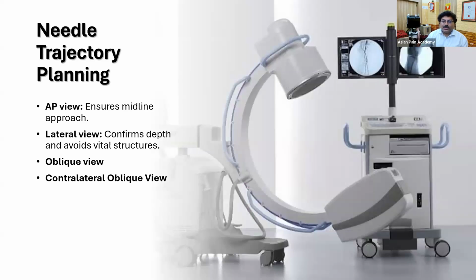Now coming to needle trajectory planning. This is important not only for detection but especially for our procedures. The AP view is important to find the midline approach, and spinous processes are our usual guide unless there is scoliosis. It gives us an idea where the midline is. The lateral view confirms the depth and also avoids important vital structures. The oblique view is important for the foramen, and also the contralateral oblique view.